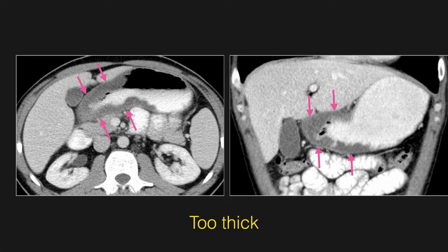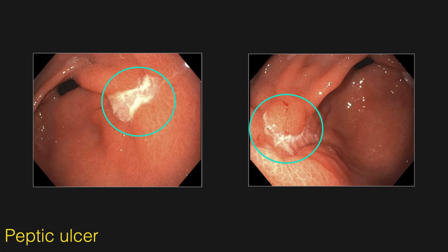But what do we think? Is this inflammation or is this cancer? Well, first, notice how it's relatively low in attenuation. This indicates edema and inflammation are the primary cause of increased wall thickness. And indeed, this patient was referred to gastroenterology and underwent endoscopy, where they found several superficial ulcers in the gastric antrum.